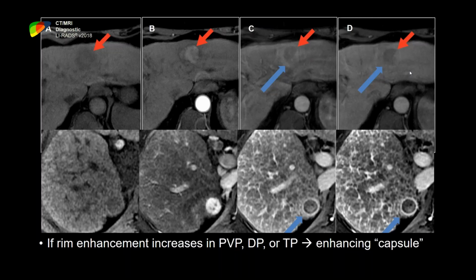Please, in such a case, we can use the pre-contrast for knowing the actual size of the lesion. Absolutely. Not the delayed. If it is very clear and very defined like this case, we can switch to the non-contrast and use it as the actual size and in defining the LI-RADS. Absolutely. Yeah, I think so.